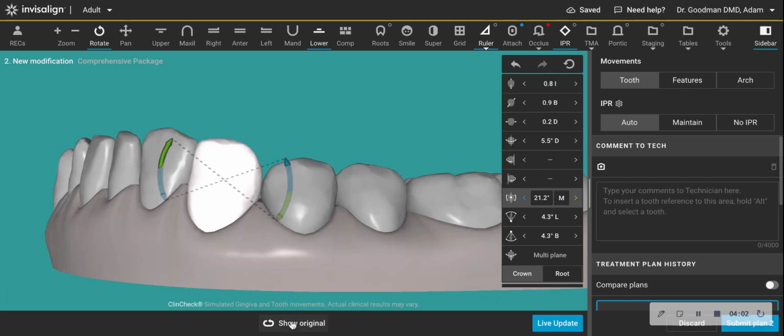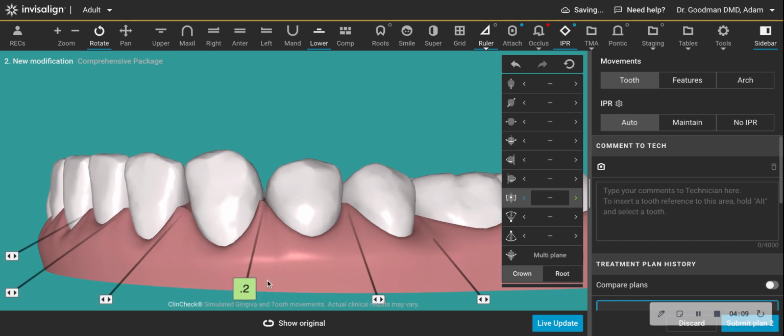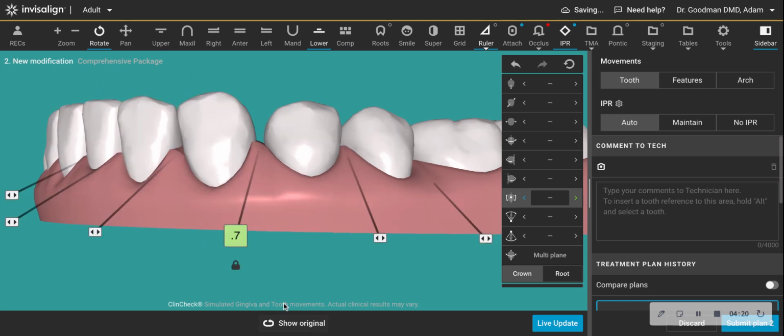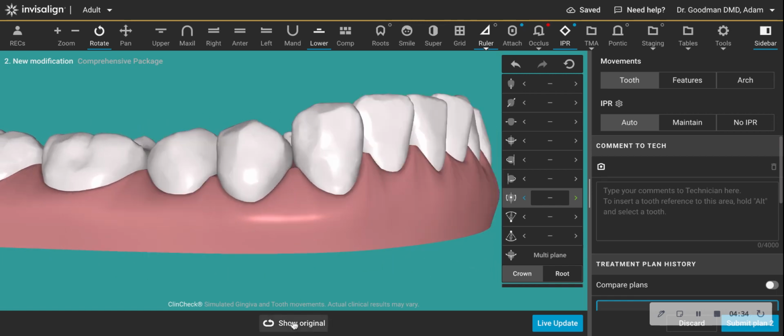Now, again, you might think, well, wait a minute, didn't I just accentuate the problem? Well, here's what I'm going to do. This is a mandibular deficiency, and that is how teeth are going to move. Now, you might be thinking, what about that space? And I'm going to say that is going to be a space that the patient's going to accept. Let's see on this side.